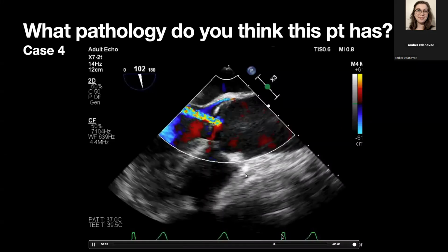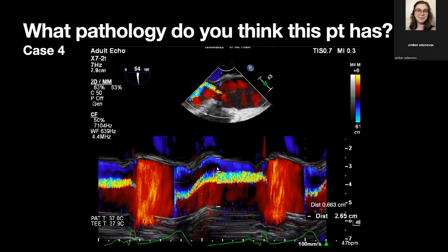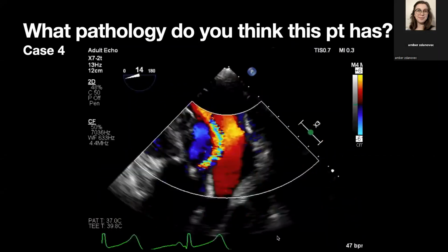So this is when you're looking here with the regurgitant jet. Now it is eccentric, so this might not be the greatest mechanism. I gave you measurements here, but just looking at this, the cutoffs are 25% and 2/3. Doesn't look that impressive, does it? No. So we're kind of getting discordant values here. Okay.